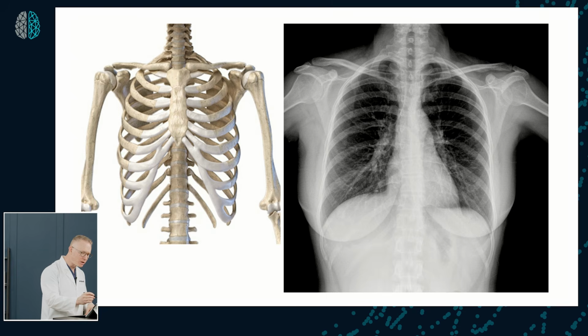Well, one of the things that you want to look at is the medial aspect of the clavicles, or the clavicular heads. So here's your clavicle here on the left side, and here's your right-sided clavicle. And you're looking at the clavicle and the clavicular heads in the context of the spinous processes that are also exposed. You can see those here running down the cervical and then eventually into the thoracic spine.